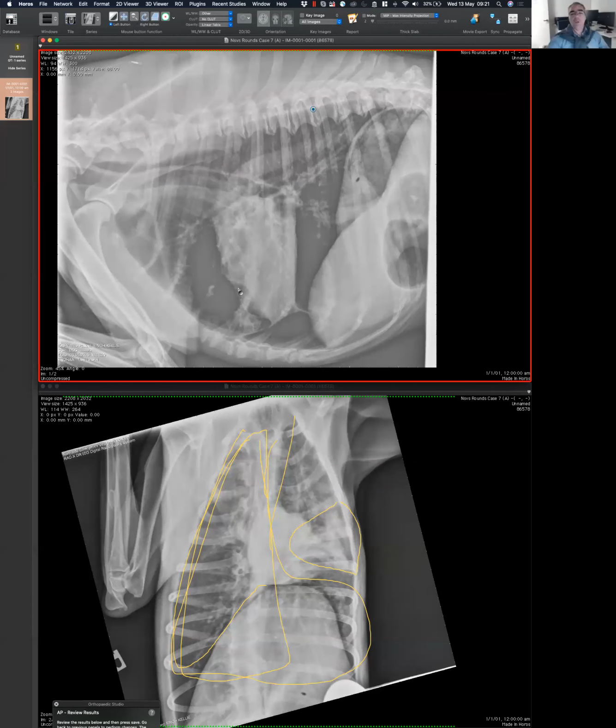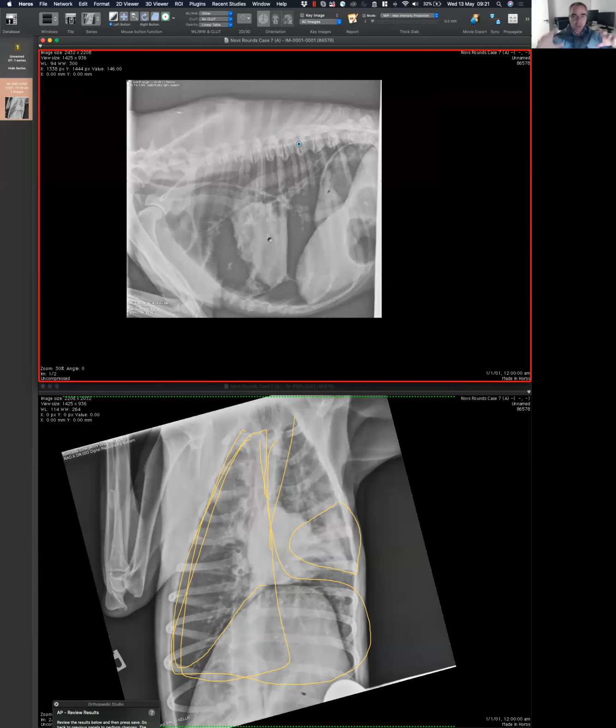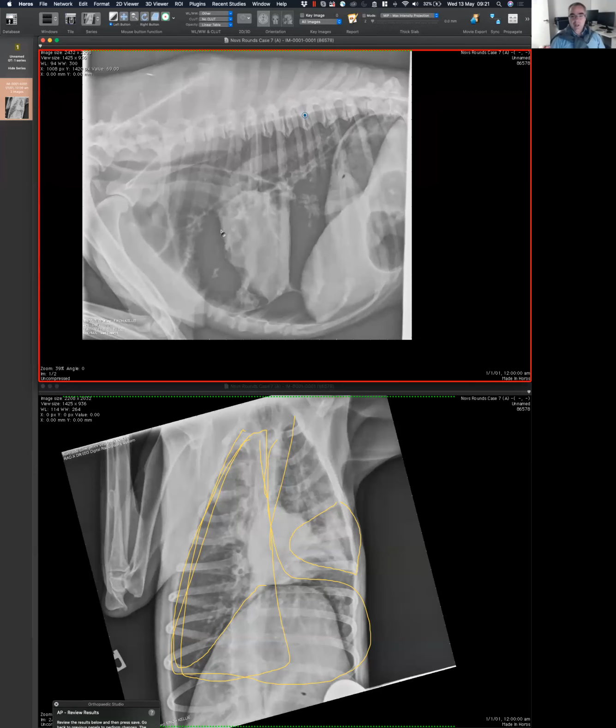What about the quality of the radiograph? What about the exposure? How much are we including? What about the collimation? In this case, it's very likely, I'm 100% sure, I don't know how to convince you if you are not, that what is happening here is not that there is no lung, it's that we use so many x-rays that now there is no difference between a thin soft tissue structure and the air surrounding that. So we are overexposing.